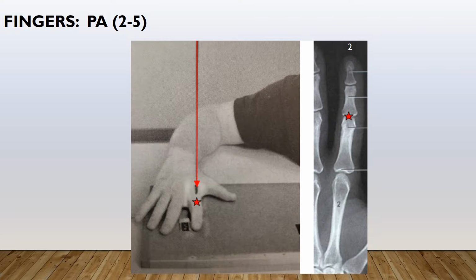And that's where you're seeing the star here. And when I am hanging my x-rays on my computer, or like back in the day when we used to actually hang x-rays at the hospital, we would want to hang the patients from the fingers down. So this is how you want to have your x-ray on your screen. You would want to make sure that it is from the finger down. And you also want to make sure that you are putting a number on top of your image, and you're also putting a right or left marker. Now, as you can see on this x-ray, the right or left marker is actually not showing, but you want to make sure that you do have a right or left marker.